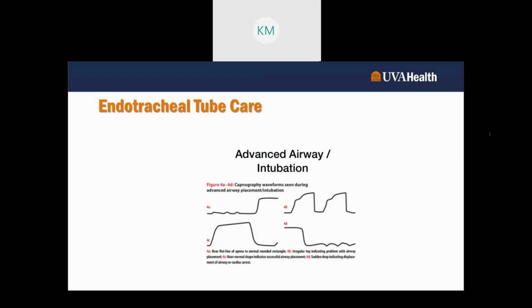Finally, we're looking at 4D, which is a sudden drop. So this indicates one of two things to me. The tube has become displaced, as in my patient may have pulled my tube out, or maybe my equipment got pulled and it started yanking on the tube, or something bad has happened. Or the worst case scenario, and yes, there is a worst case scenario, is my patient is in cardiac arrest. So neither of those are ideal. So this is one of those waveforms that you see that you kind of bust into that patient's room to see what's going on if you're not already there. So go in, again, checking your patient.